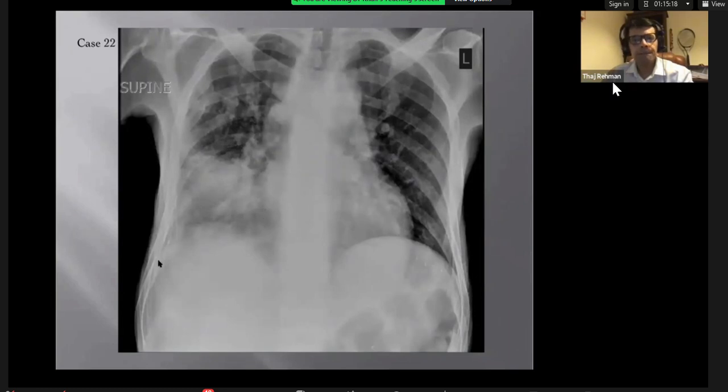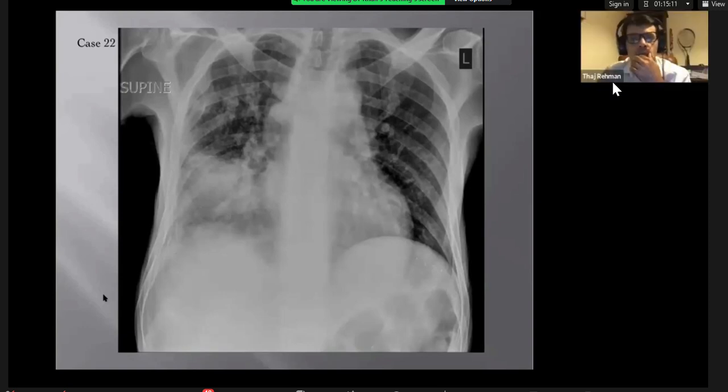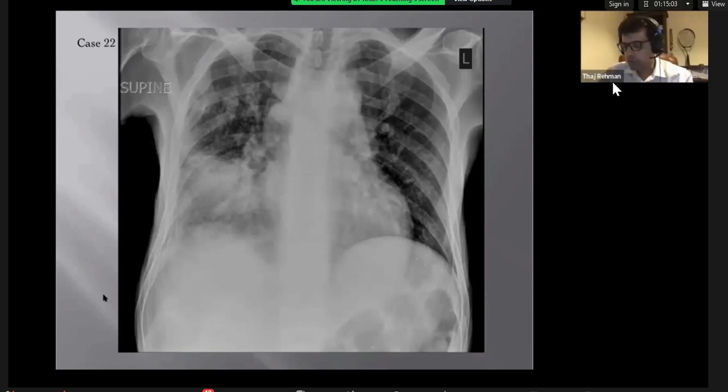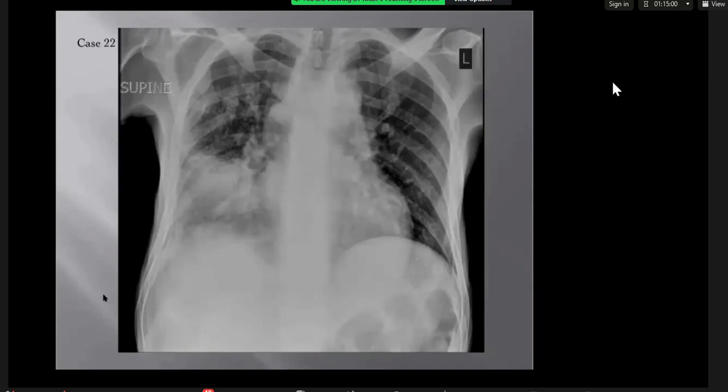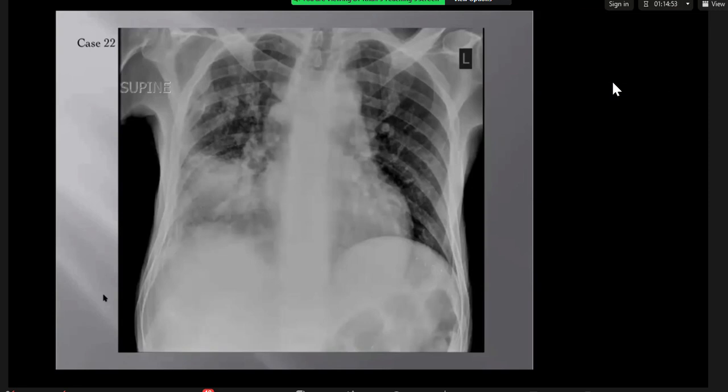So there's a frontal chest radiograph demonstrating a few abnormalities. The main one is the large irregular opacity projected over the right lower zone. I think they are coalescent nodules, because I can see a cluster of nodules which I think will coalesce together. There's also some nodularity. Ignore the nodules. So there is a large opaque mass in the right lower zone.